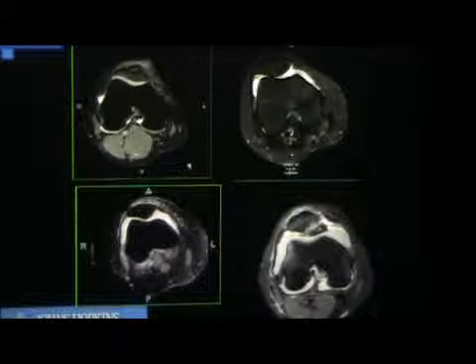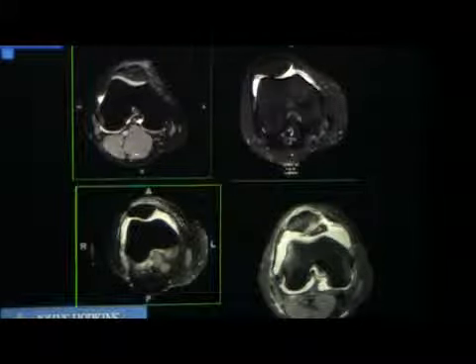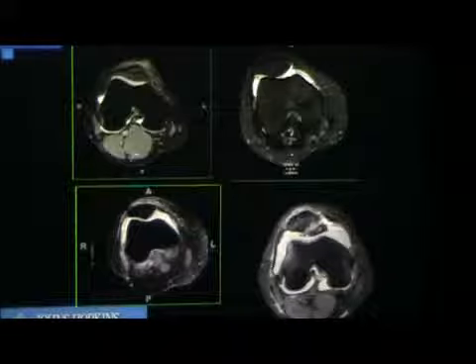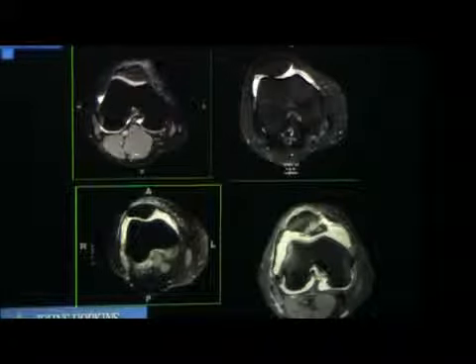Okay, yeah. Do you pay attention to the trabeculation in the areas where you have low T1 signal as an indicator of benignity? That's useful in X-rays, usually not on MRs. Because MRs are very sensitive, even you can pick up small stuff. So you could have leukemic infiltrates in between the trabeculations. Those will be still preserved.